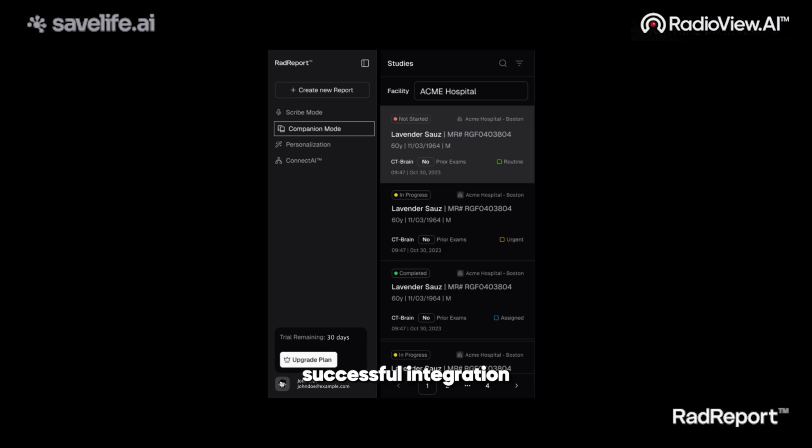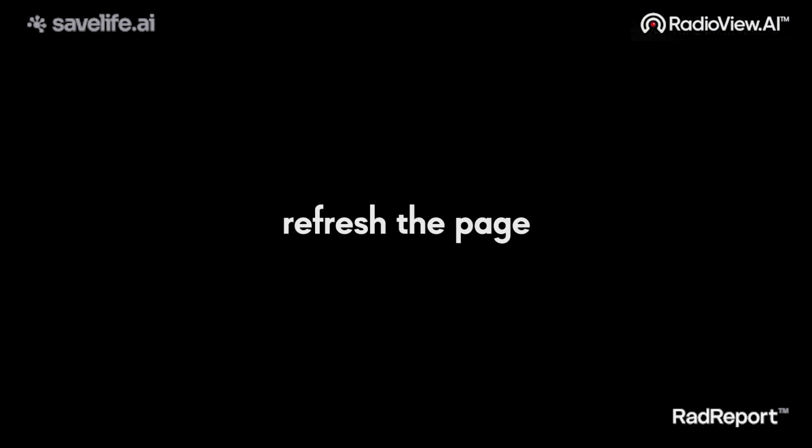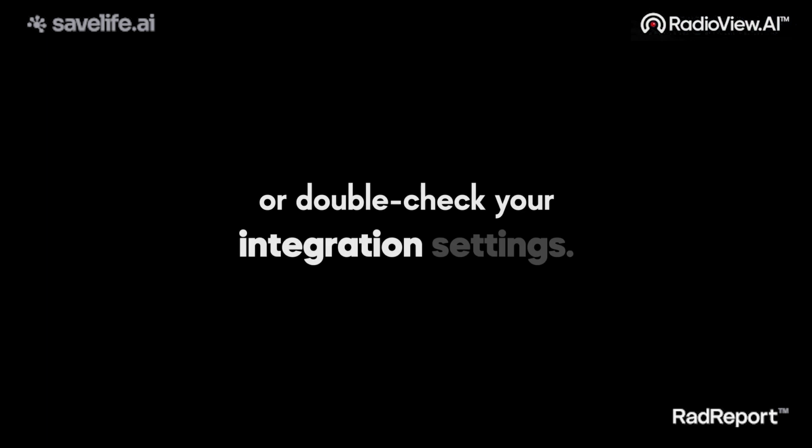You can also verify successful integration. Here, you'll see all studies received from your PACS or fetched by RadReport. If studies don't appear immediately, refresh the page or double-check your integration settings.